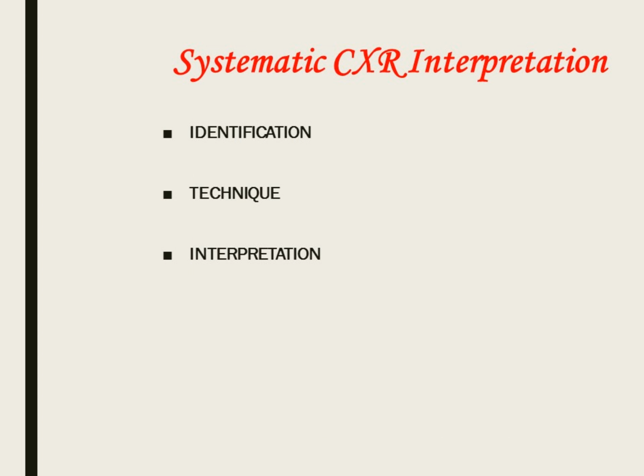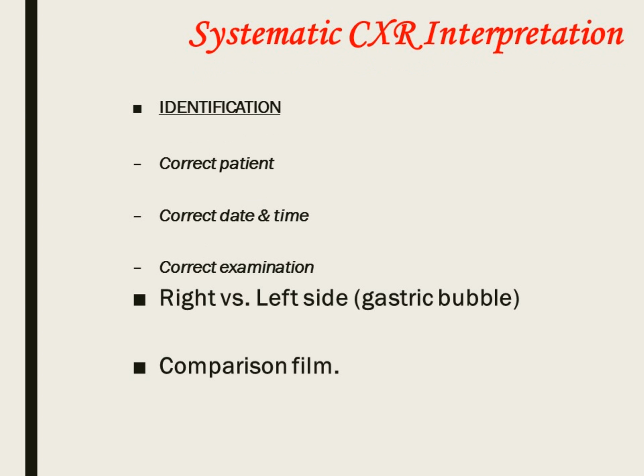So how do we systematically approach X-rays? Well, most important, identify the patient right, and check that the technique was done right, and interpretation of the X-ray comes last. So, identification: is this the correct patient? It happens all the time. Trust me, not just by doctors, but by nurses and radiologists. I sometimes get called about the wrong patient, wrong X-ray, wrong CT, so make sure you actually have the right patient and you're looking at the right study. Is it the one we just did in the ICU 10 minutes ago, not the one from yesterday?